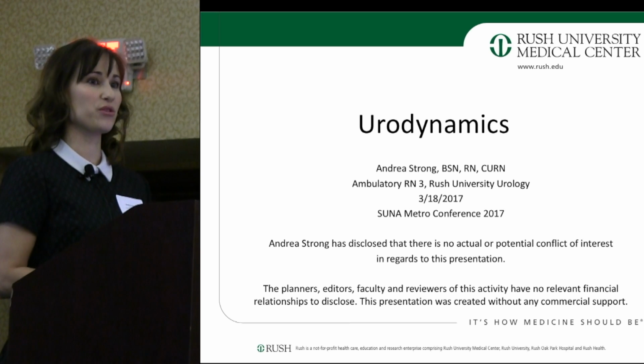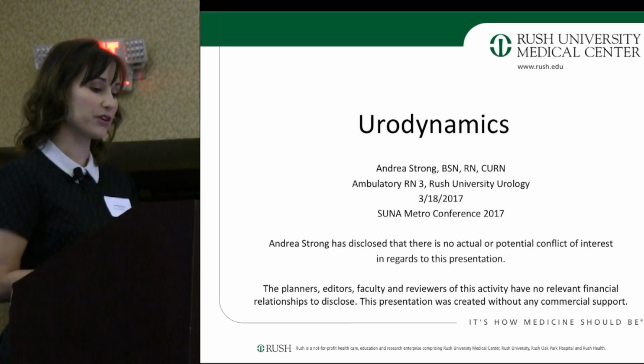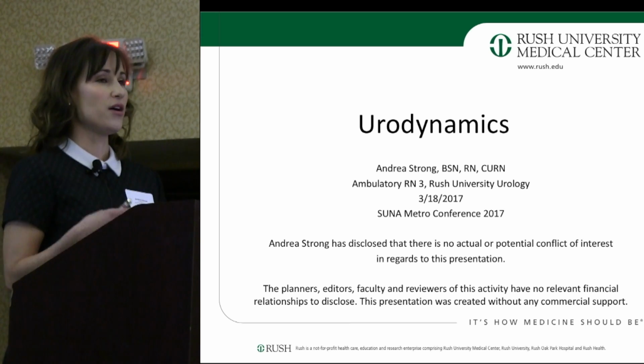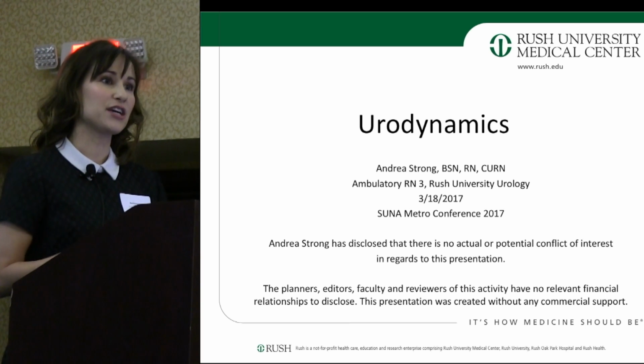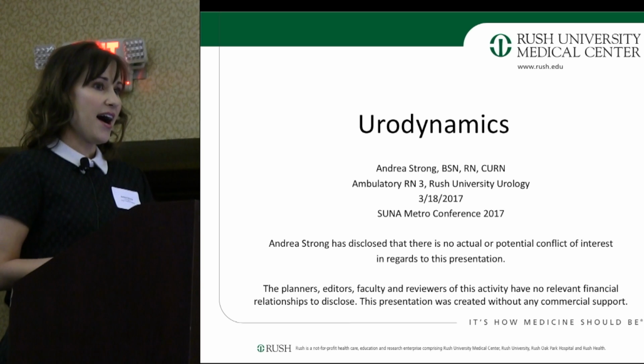Today I'm just going to share with you a couple basic things. A few of these are reviews that Lori covered, but mainly I want to focus on the tracing piece. So what are the common tracings that you may find that are associated with common diagnoses.